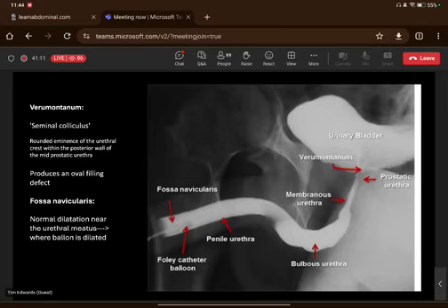So working down from the urinary bladder, in a male, we have the urinary bladder, and then the first segment is the prostatic urethra. Something that I did see in practice questions that I did last year was this area being arrowed, the verumontanum. This is an area of the posterior urethral crest which on these studies produces a filling defect within the posterior part of the prostatic urethra. So that's something to be aware of.